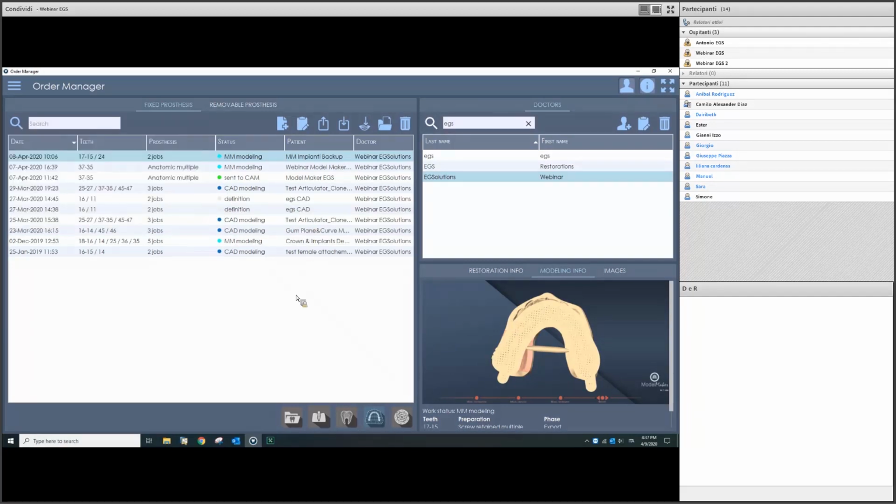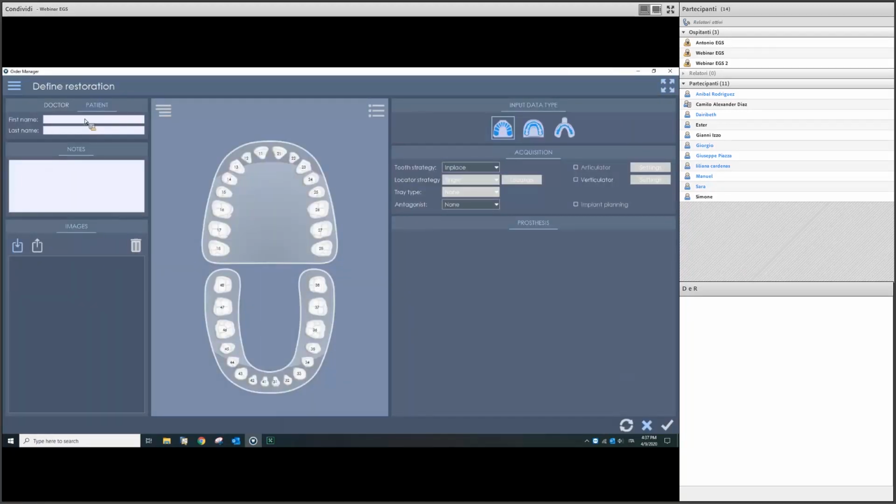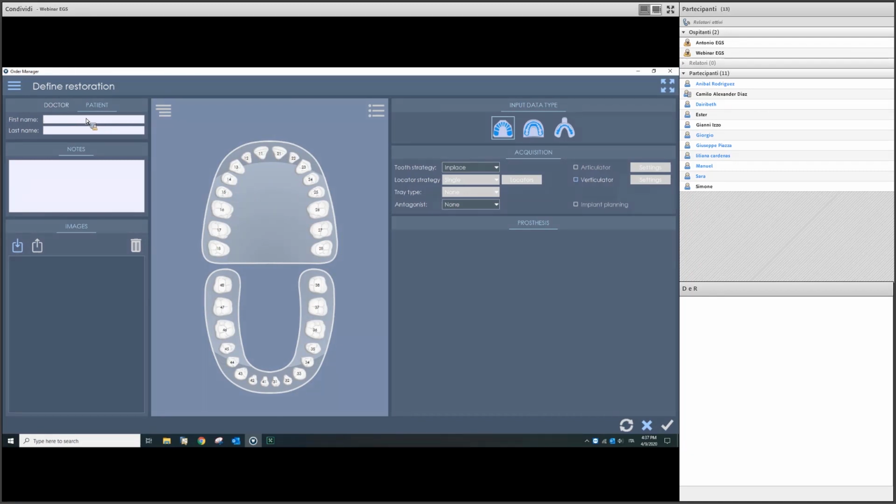So let's do a new job. Just click here, fill these fields, insert my name. Clearly, if you have some questions, please write them down on the chat so we can answer you later. Let's proceed with our job.